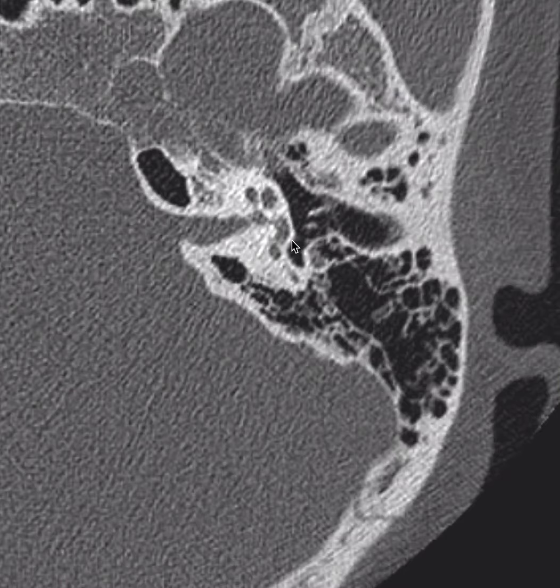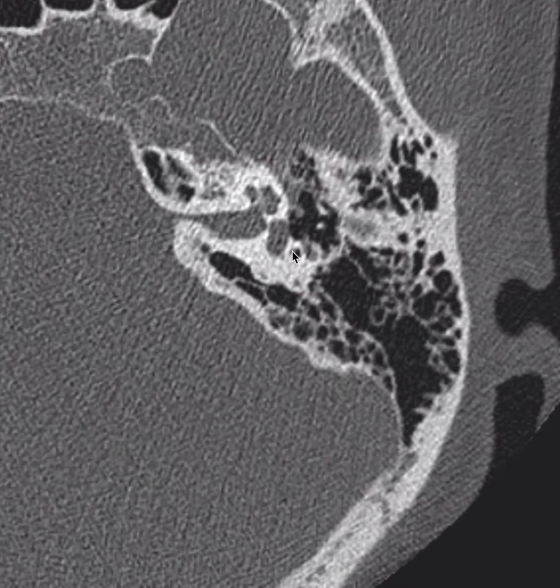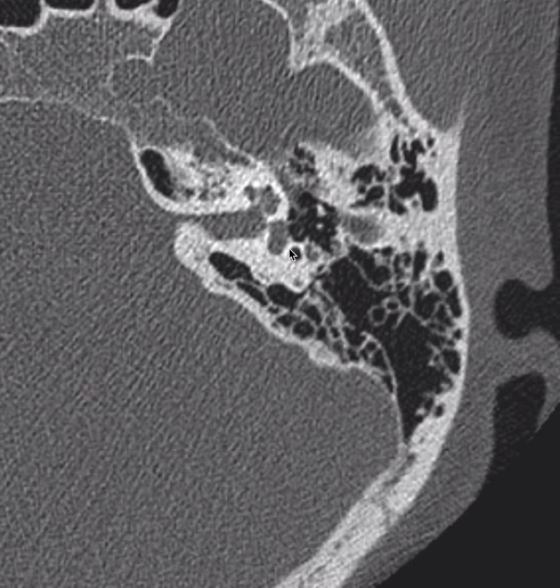The cochlear promontory is interesting because it has a superior and inferior bony projection called the ponticulus and the subiculum respectively. So let's look superiorly at our cochlear promontory by going back up. So up here is the top part of our cochlear promontory. And you'll notice right here there's a little bony spicule. This is called the ponticulus. Behind it is where we see the sinus tympani.